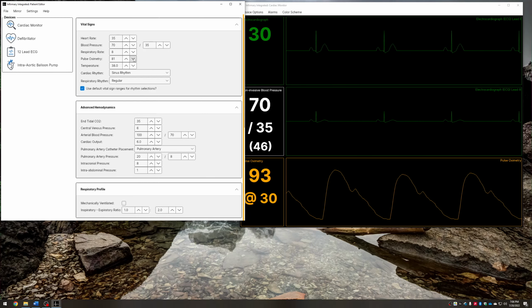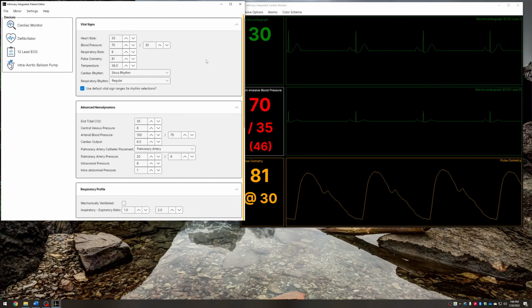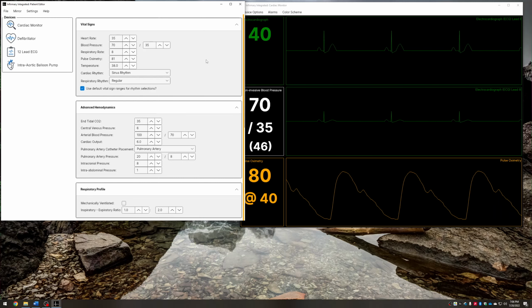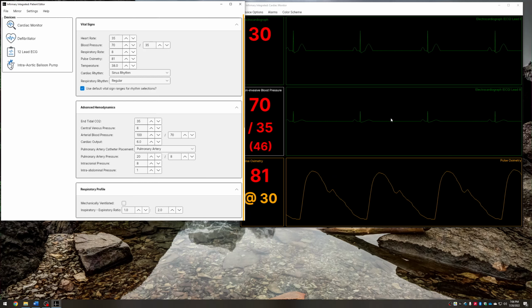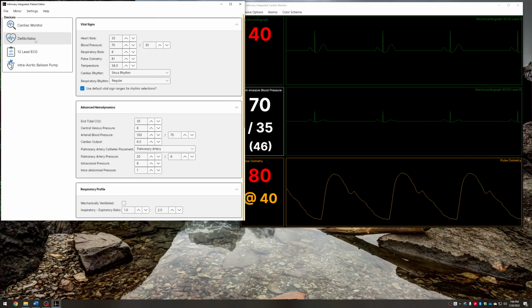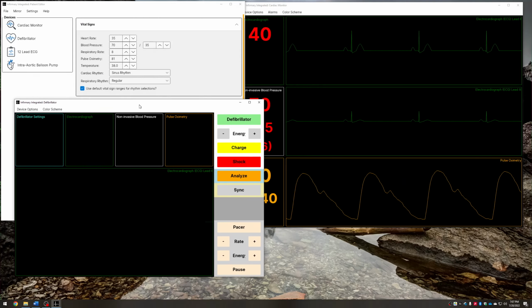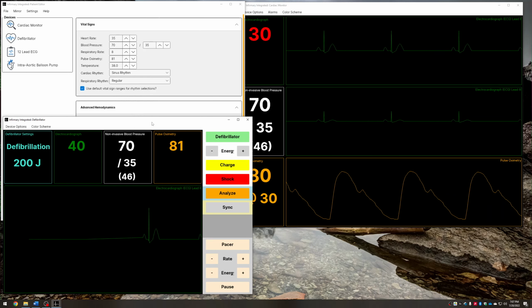And now I want to move on to if we were actually going to treat this patient, thinking of what we might do for this patient. In emergency medicine, I know that if a patient is in sinus bradycardia with unstable signs and symptoms and end organ perfusion, we would likely use pharmacologic measures to increase the heart rate, but I'm going to open up the defibrillator and we're going to work on some transcutaneous pacing.